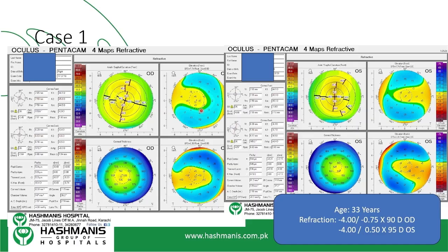So if you've got, for example, this elevation data, you can go right at the thinnest point. So what is the thinnest point? Depending on the machine that you're using and the settings that you've used, this little circle shows you where the thinnest point is. It actually gives the value of the thinnest point here. And that value is what's important if you're just looking at the data.